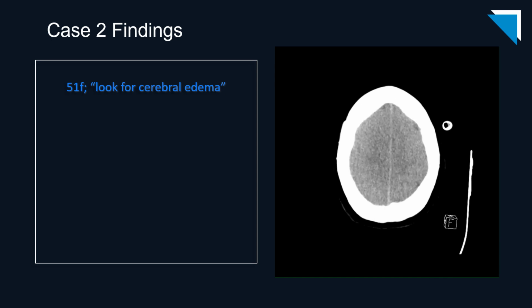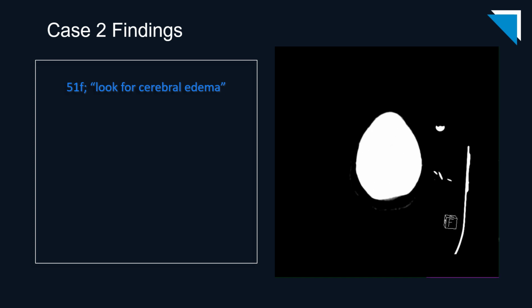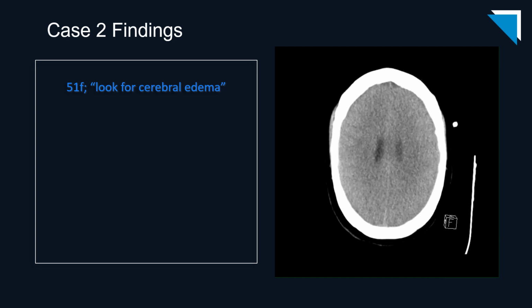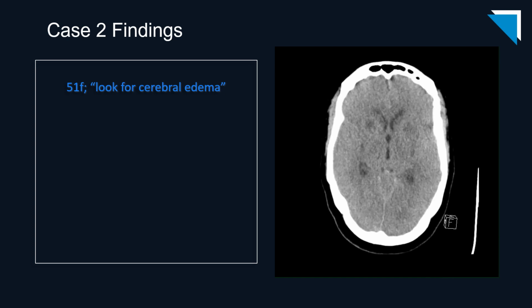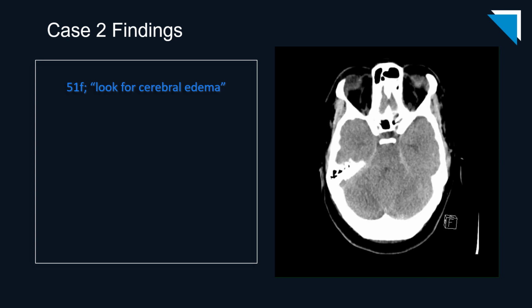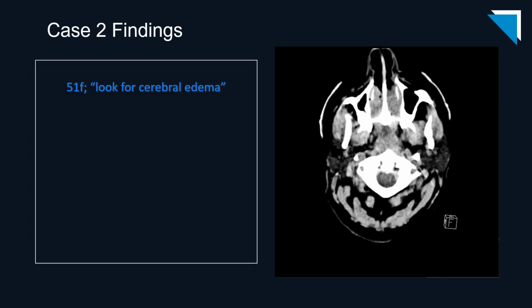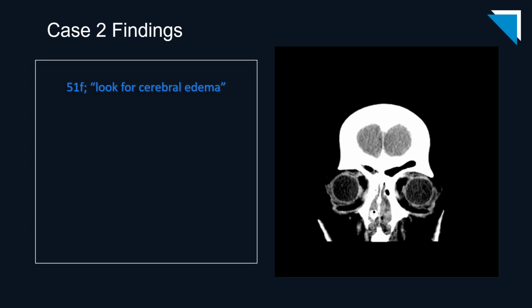Remember the findings we just discussed and be on the lookout for those. As always, you can pause the lecture at any point if you want to scrutinize a particular area or finding. The coronal images from the same study.